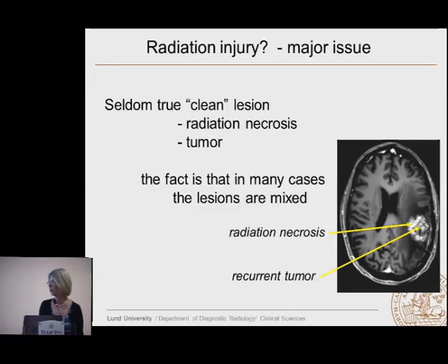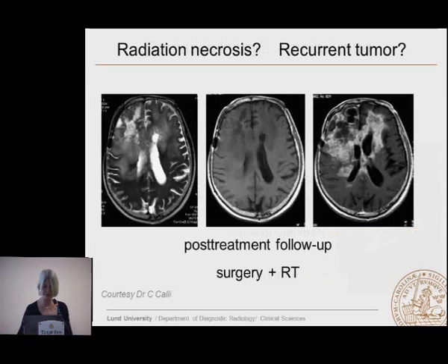The patient went to surgery, and it came back, and all this here that I had said was radiation necrosis was radiation necrosis. But that little thing in the center that was bleeding, that was recurrent tumor. So it didn't help much. Luckily, the patient went and had his surgery. And I think this is what we deal with quite often, that we have a mixture of both radiation injury and recurrent tumor. So if we're going to evaluate these patients, we need to do spectroscopy, or we need to look at the whole tumor, the whole volume, and not just one slice before we make our decision.